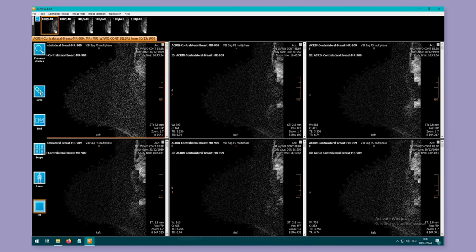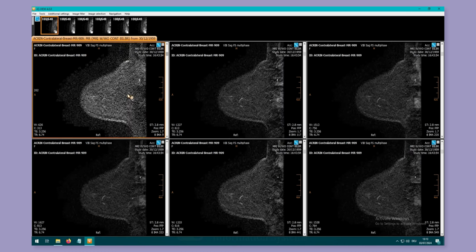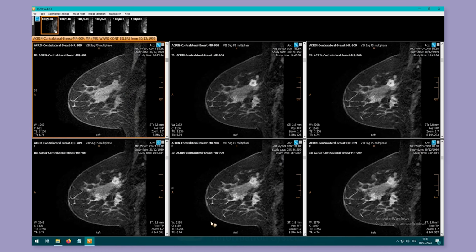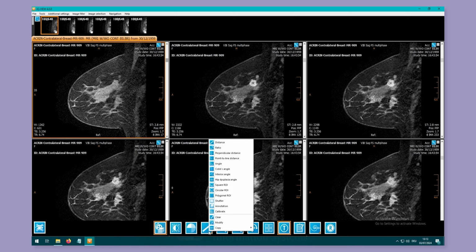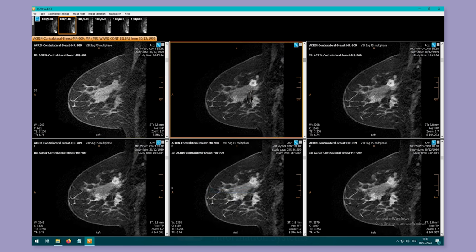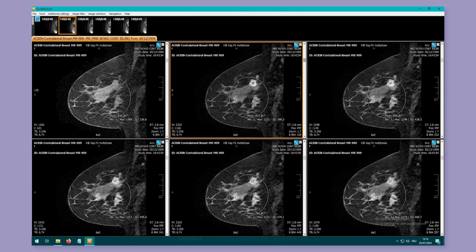To use the system synchronization, you can now use the familiar Sync button in the left toolbar. This only synchronizes the phases displayed in the respective tiling. If you use the small button in the thumbnail bar, all phases are synchronized, and the 3x2 tiling is automatically applied. Now draw the area over which the contrast curve is to be created.